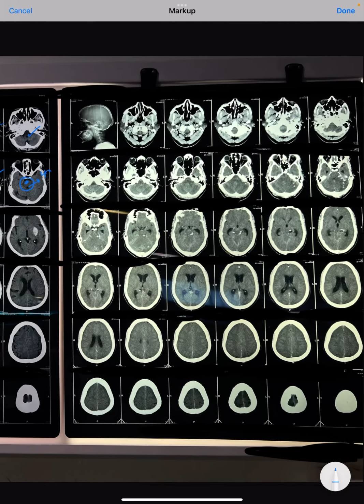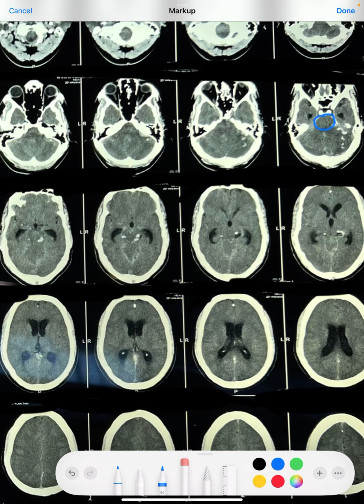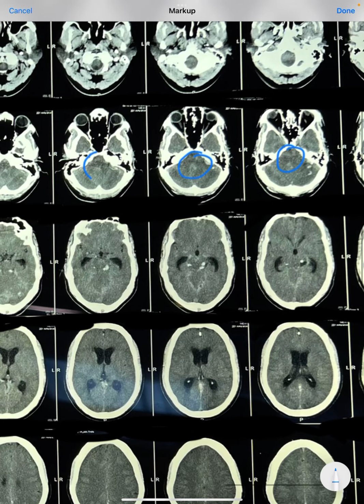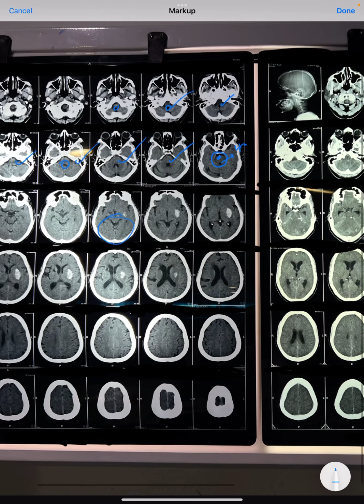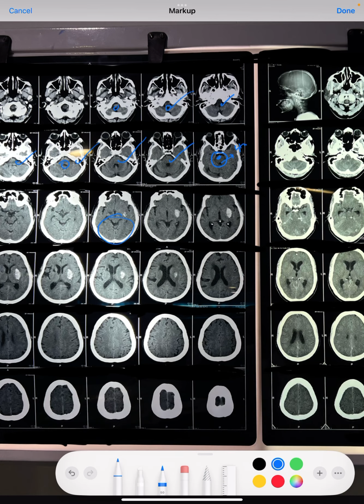But in here, the fourth ventricle is not traceable. You can see the pons, and just behind that, you can appreciate the fourth ventricle beginning. But in here, the fourth ventricle is not at all apparent. So definitely there is obstructive hydrocephalus. And apart from that, the age difference is definitely there between these two patients.